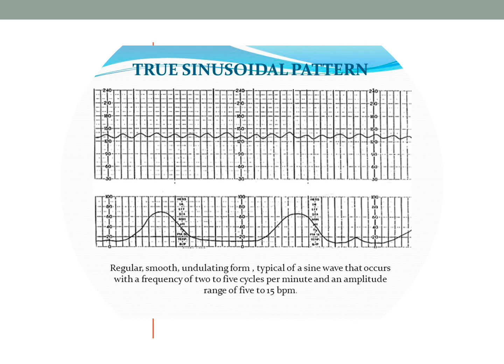Sinusoidal pattern. Please note there is such a thing as a pseudo sinusoidal pattern. So you'll have a strip that looks like this, but your baby's not really in distress. It could be that they are sucking on their thumb, or it could be that mom was given a medication, some type of anesthetic, maybe magnesium, maybe some type of medication that changes the baby's heart rate. So how do we know which one's the true sinusoidal pattern and which one's the pseudo? A pseudo sinusoidal pattern can be broken. Okay, if I have this pattern and I reposition my client and the pattern changes, then it wasn't a true sinusoidal pattern.